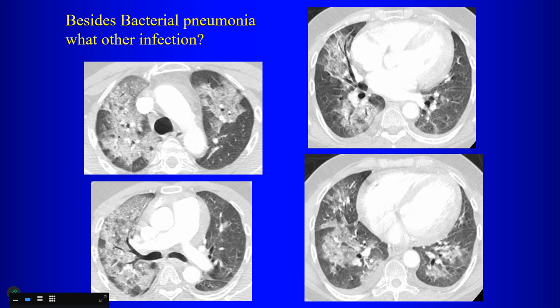They're predominantly what attenuation? They're what? High attenuation? No, not high attenuation. What do we call this? Oh, like ground glass? Yeah, these are predominantly ground glass opacities, right? You can see the underlying lung architecture through the opacities. So it's predominantly ground glass.